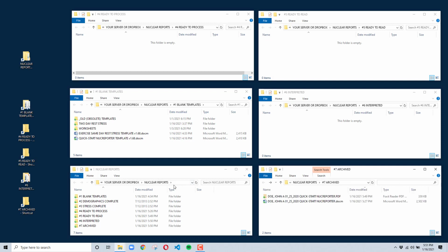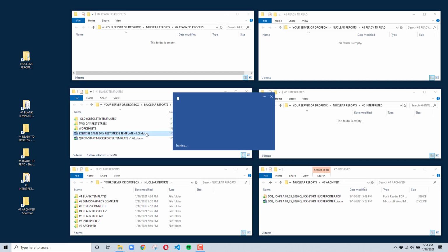So anyway, what I'd like to do now is create a report from scratch and start going through exactly how to use this. So we're going to use this exercise same day rest stress template, and we're going to open it up. And again, I apologize for having an older version or an older laptop.